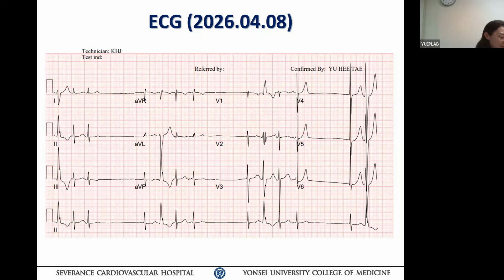So three consecutive QRS groups were written. The origin probably may not be sinus because the QRS morphology is different from the sinus QRS. So I think it is basically a junctional rhythm, very non-sustained, a 3-beat junctional rhythm. The heart rate is almost 100.